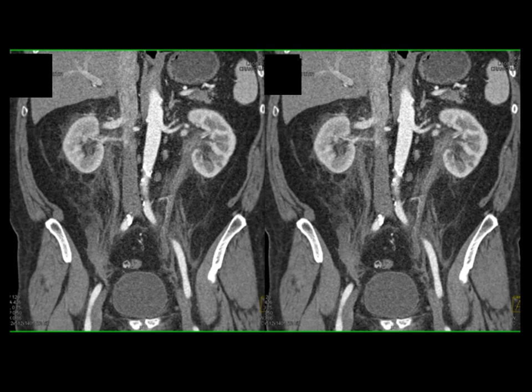Now, in terms of what else we can look at, the ability to see information, to see images, is often a challenge. The ureters are often a super challenge to me, and so I do find it very important to really analyze the cases carefully.